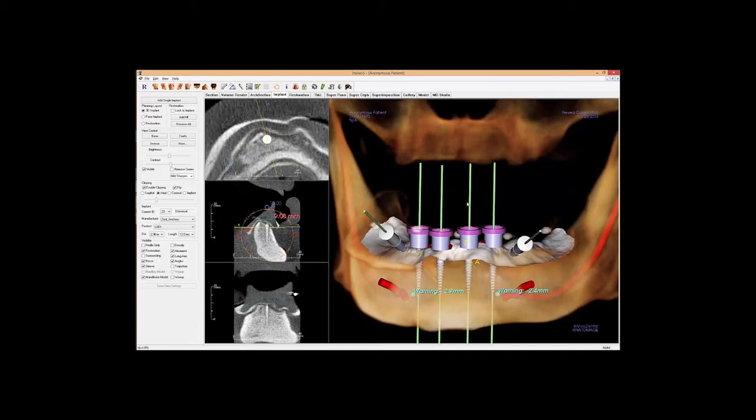My recommendation is, once you get the surgical guide in your office, check to make sure everything looks good. Seat it on the stone model, make sure the fit is good, just to verify for yourself. And if it's your first case, you can just practice drilling. Drill straight through the guide using the model. Get a feel for what that process is like, switching out instruments, because it is, if you've never done it, a little bit of a different process. Not difficult, but we definitely want everything to be as smooth as possible for the day of surgery.